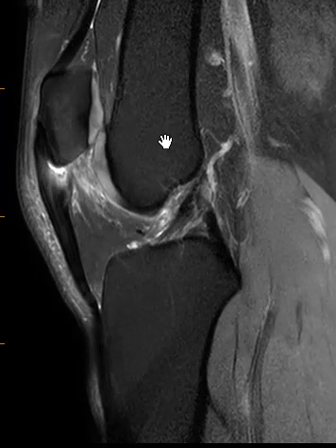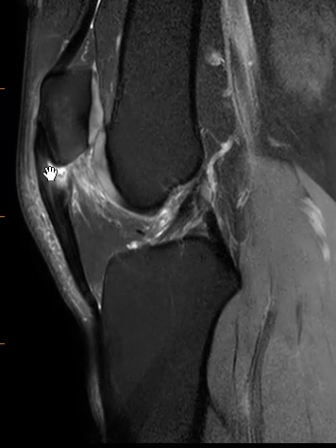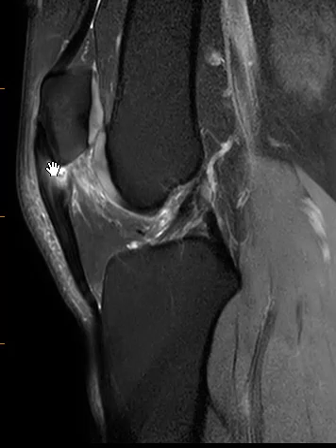Now, if you had a child and they had an ossification down here along the inferior aspect, this can be associated with a similar thing where the children have injury at the patellar tendon attachment and they can get new bone formation, and they call that Sinding-Larsen-Johansson disease. So if you see a child, think about that. An adult, we call it jumper's knee, as in this case.